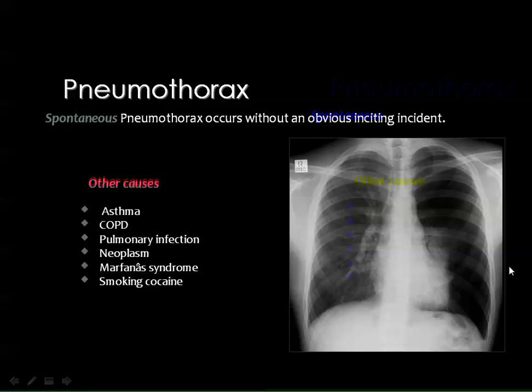Then this is the appearance of pneumothorax in the chest X-ray, and you have hypertranslucency of the affected hemithorax, absence of vascular lung markings in the translucency. And if you look carefully against the hilum, especially against the hilum, you will see the collapsed lung. And you should remember that the collapsed lung is not opaque unless it is totally collapsed. And this lung is subtotally collapsed, but it is still aerated, as you can see.